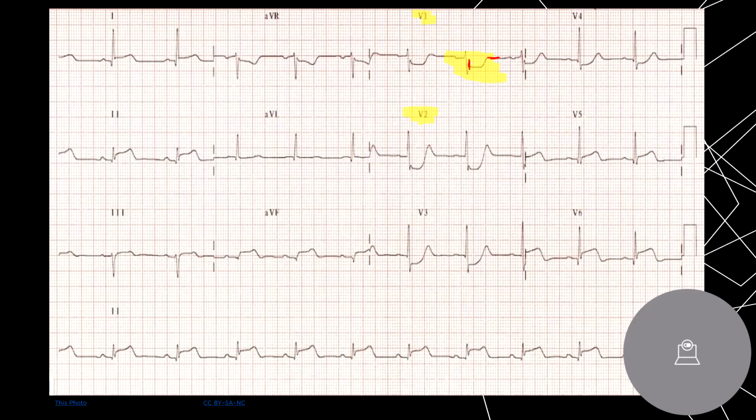This is my J, this is termination, right guys? It's like right here. Here, I'll do it over here. This is termination right here. Significant depression. Huge depression. Look at that. Boom. Boom. Huge depression in V1 and V2. Same in V3. Huge depression there.